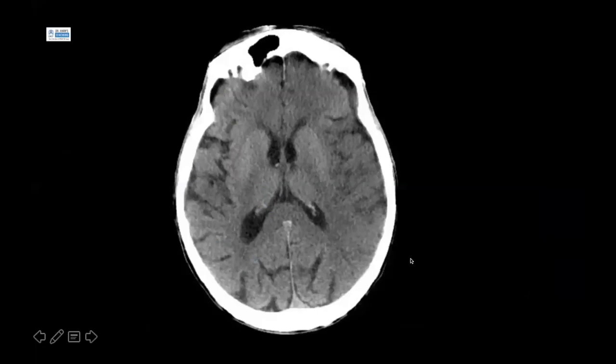So I'll just let you have a look at this CT brain. On the right, this is the sylvian fissure. And just as we said, immediately deep to it, we can make out the hyperdense, the bright insular ribbon area. But on the other side, if you compare the region immediately deep on this side and immediately deep on this side, you start to appreciate that this is lower, we've lost the bright insular ribbon sign. And this is due to early ischemic changes and edema. So this can be a very subtle early sign of MCA stroke.